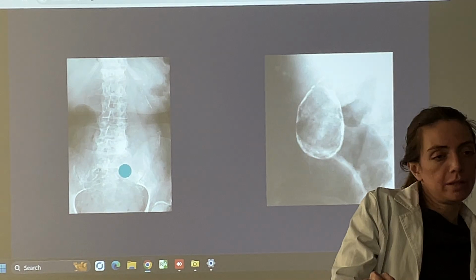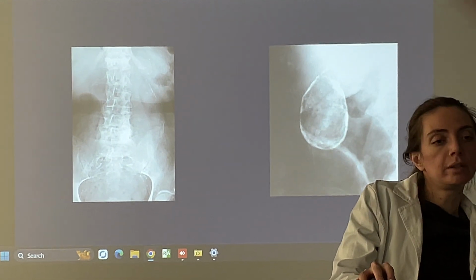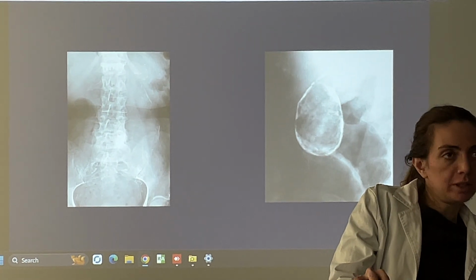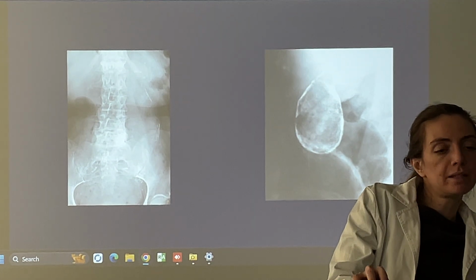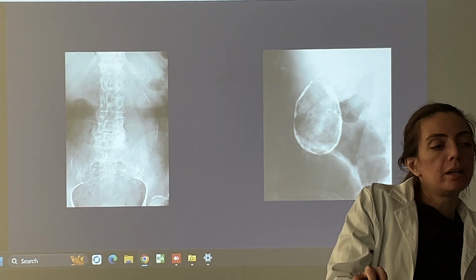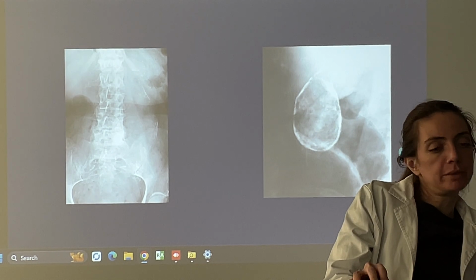Okay, so in the first image we have calcification in the wall of the abdominal aorta, which is a common finding in atherosclerosis, especially in those with diabetes. In this patient, the aorta demonstrates a rim-like calcification. And this one is the gallbladder.